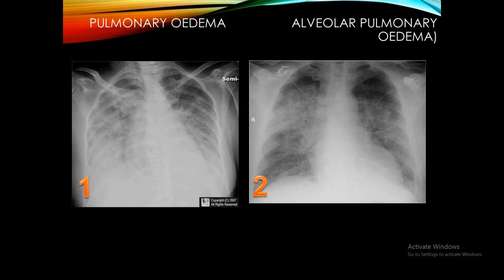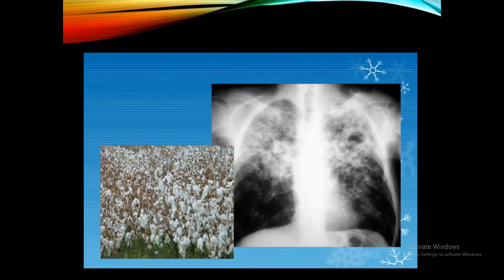Another example of pulmonary disease. In this chest X-ray, we have patchy bilateral opacifications at both lung apices. The cardiac size is normal. This is mostly a bronchopneumonia rather than pulmonary edema. It's mostly pneumonia rather than edema.